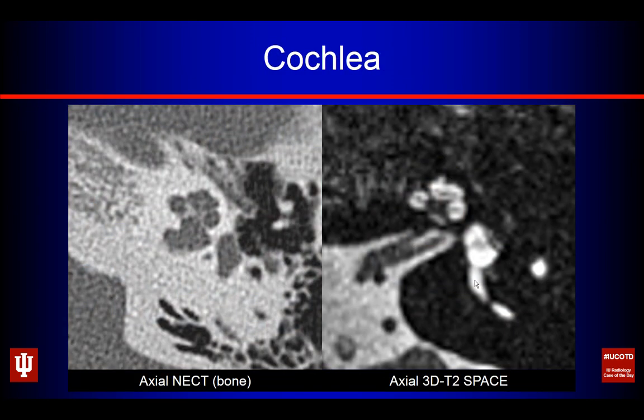So what does the cochlea look like on imaging? Well, on CT, again, it's a low density structure, but we see that snail shell kind of look. Centrally, we have this bow tie shaped bone density. That's our modiolus. And as we go back, you can also see that this is a fluid sensitive sequence, and you can see all this bright fluid. And we can even make out those chambers within the cochlea as well on heavily T2-weighted imaging.